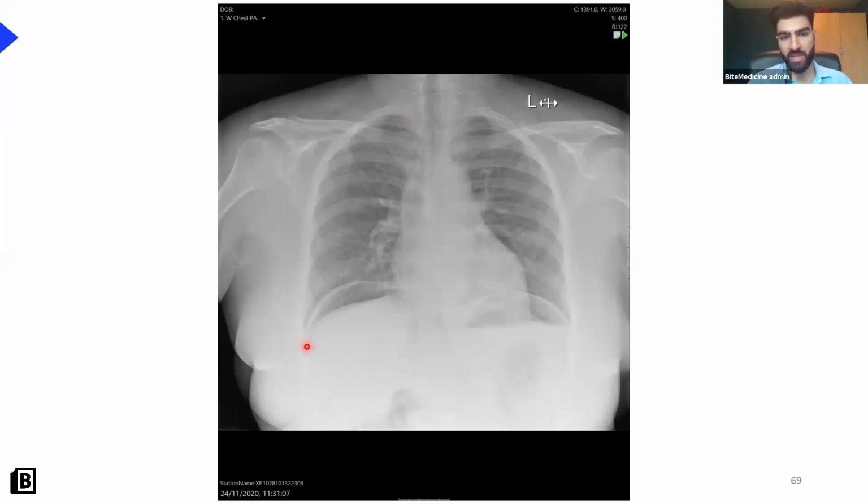Good, pneumoperitoneum, there's air under the diaphragm here. That is not normal. That suggests the patient has had a perforation. They've perforated a bit of bowel and that's released air into the abdomen and that collects under the diaphragm. That is known as pneumoperitoneum. If you miss this, the patient will deteriorate and become seriously unwell. So one to not miss as an F1 or in your first year of physician associate studies.